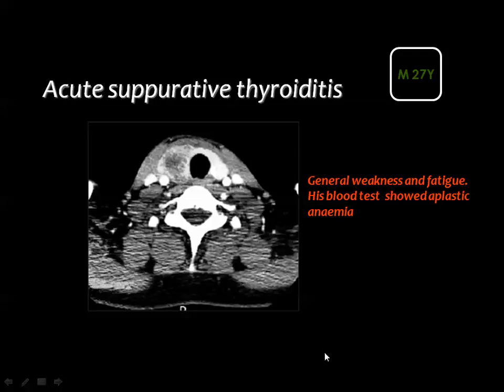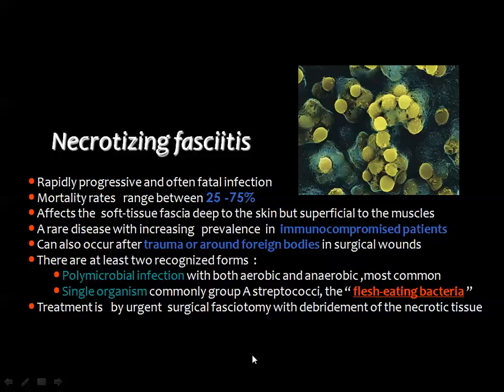Then, as I have said, thyroid inflammatory changes or acute thyroiditis has no specific imaging criteria. They show enlargement of the thyroid lobe and heterogeneous enhancement. You may see an abscess inside the affected thyroid, and of course, the fine needle aspiration guided by ultrasound is one of the major tools to confirm the diagnosis and to get samples for culture.